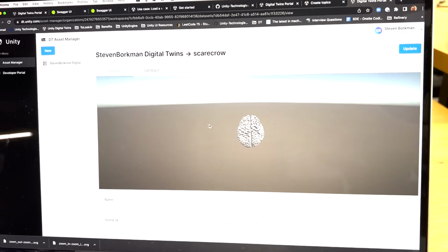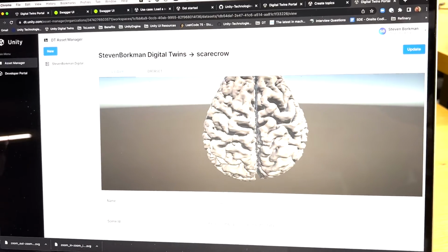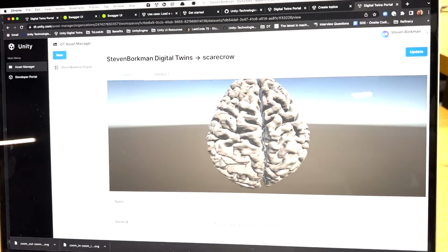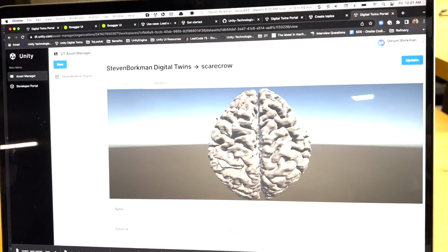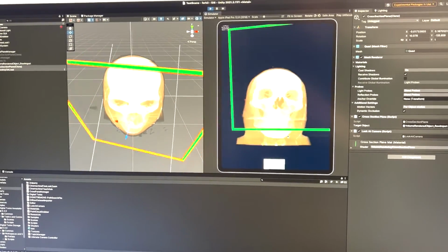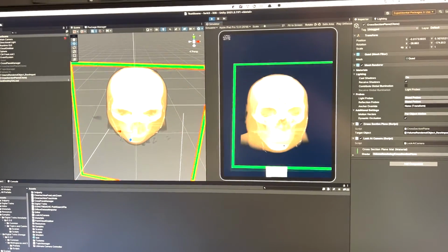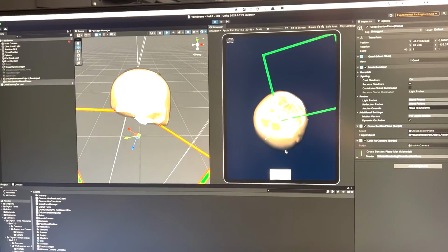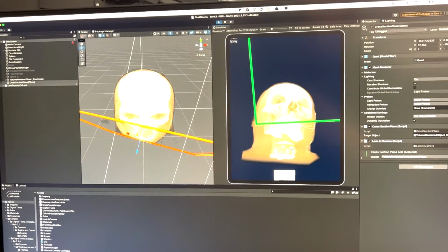Our original plan was to convert the DICOM to NII file, then to an MGH file, and then an STL file, but this would have taken 3 days to complete. So we had to come up with another method. We chose, rather than converting the data, to visualize the DICOM raw data as a point cloud.